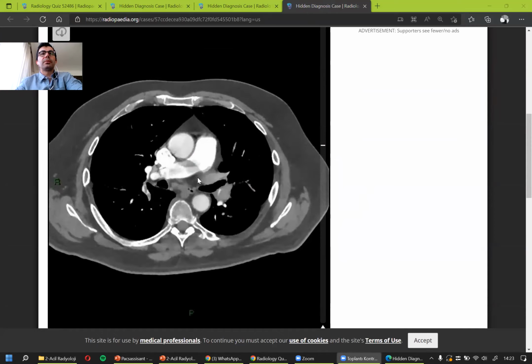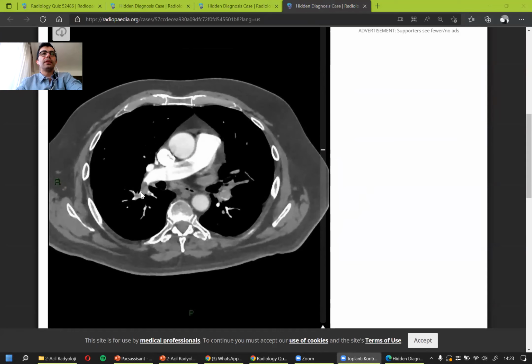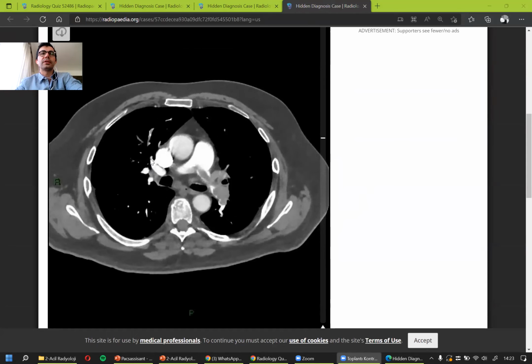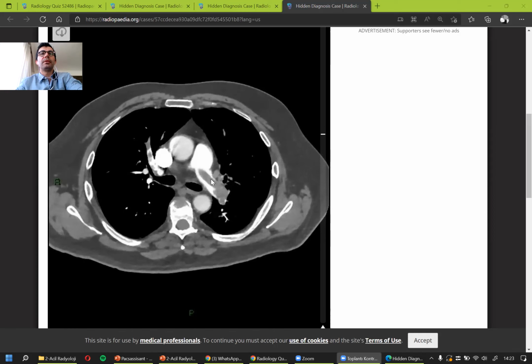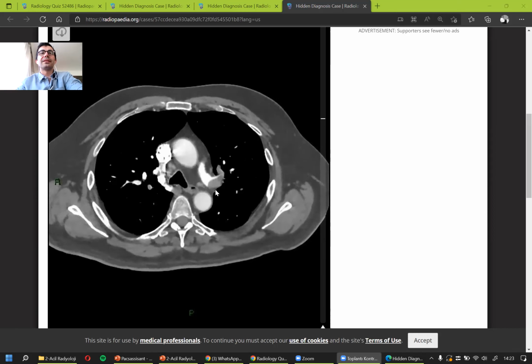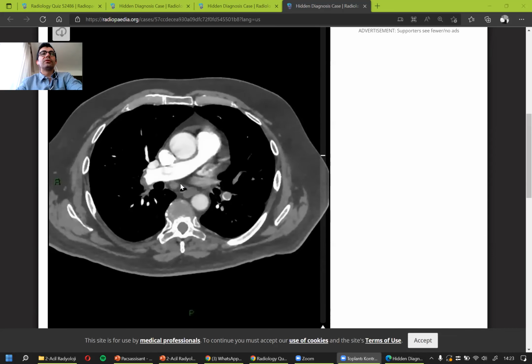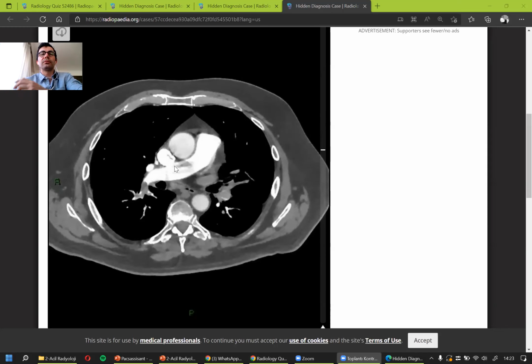When I start following them, the main trunk is empty, but after that, starting from the right one, starting from here, there were many things, and on the lower branches there were even more. But on the bigger scale, on the left main pulmonary trunk, there's a very big thing which is not shining, right? Which is obviously not receiving any contrast, and here as well. So in order to see if it's a pulmonary vein or artery, we have to start from the center.